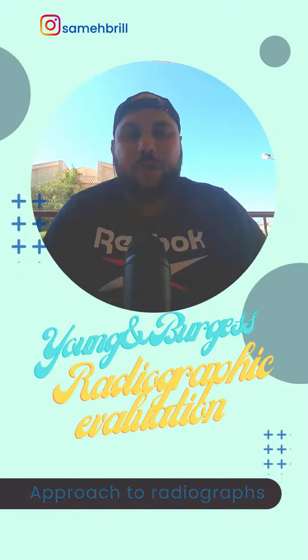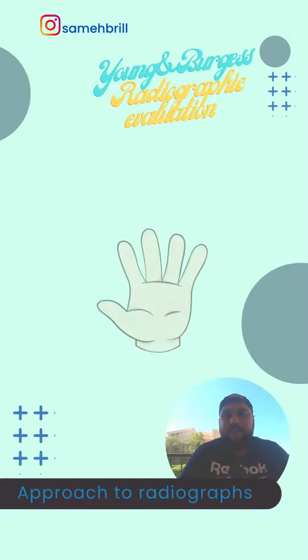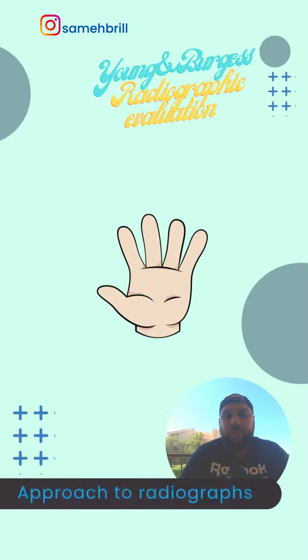Today, we will discuss how to approach pelvic fractures and how to classify them according to the Young and Burgess classification system on the x-rays. First of all, I have five major points that I need to keep in mind in order for me not to miss any fractures on the x-rays.